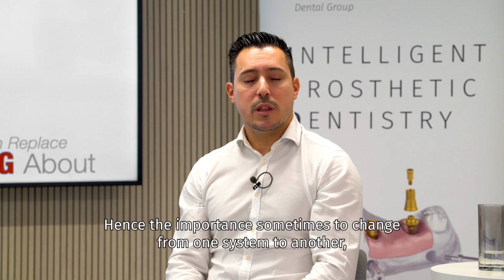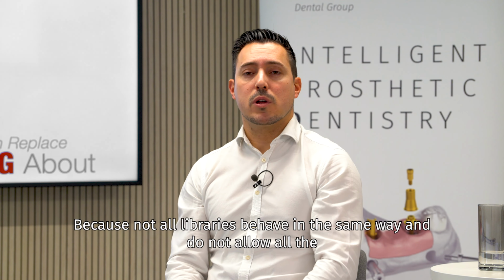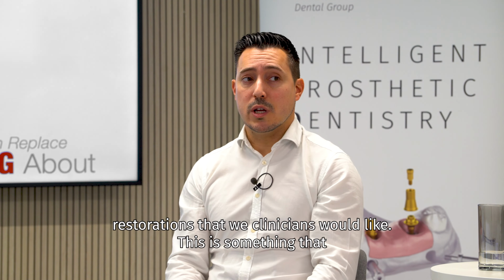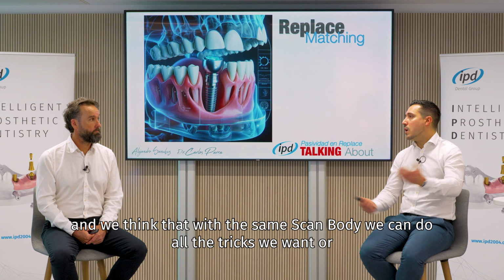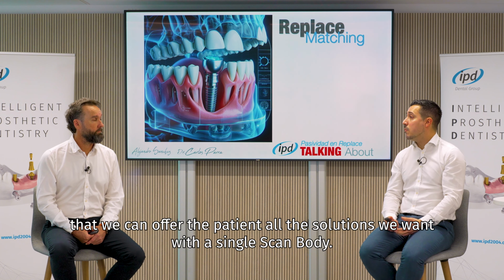Hence the importance sometimes to change from one system to another or to change from one library to another. Because not all libraries behave in the same way and do not allow all the restorations that we clinicians would like. This is something that Alejandro is quite unaware of from the clinical point of view. And we think that with the same scan body we can do all the tricks we want, or that we can offer the patient all the solutions we want with a single scan body.